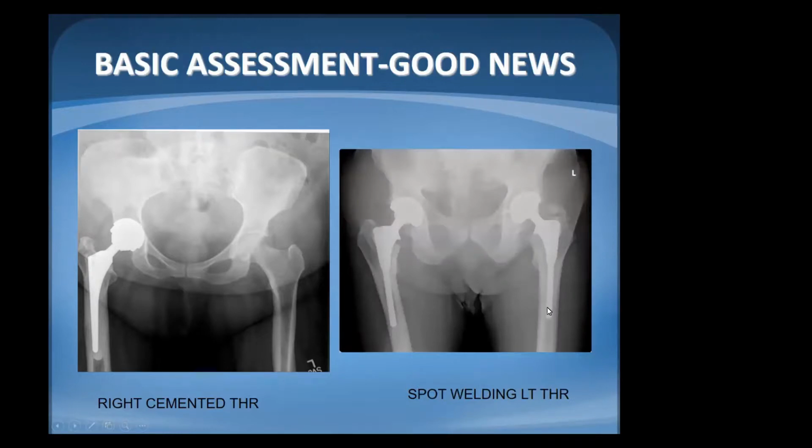More good news on this side. If you look at this side, it's got the stress shielding in here on this valgus placement and a little bit of deformity. The problem needs addressing. On the contralateral side, there is increased cortical thickness. Look at the cortex here, look at the cortex here. So there is good incorporation of the stem with a strong bony reaction with thickened cortical bone.